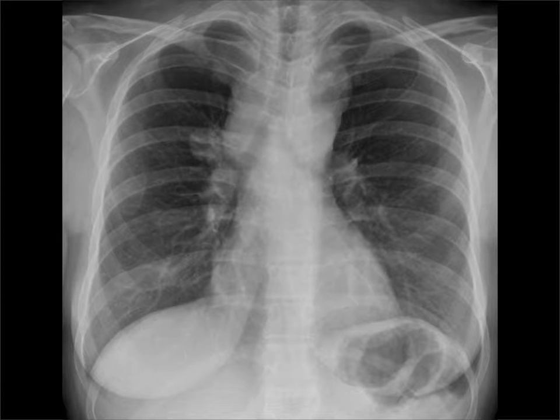This is a patient who has sarcoidosis, and what we can see here is a big, thick right paratracheal stripe, clearly bigger than 5 millimeters. They've also got a lot of stuff in the left paratracheal region coming up against the aortic arch, and they have some hilar adenopathy, at least on the right, so sort of the classical inverted Y appearance, as it's called, of sarcoidosis.